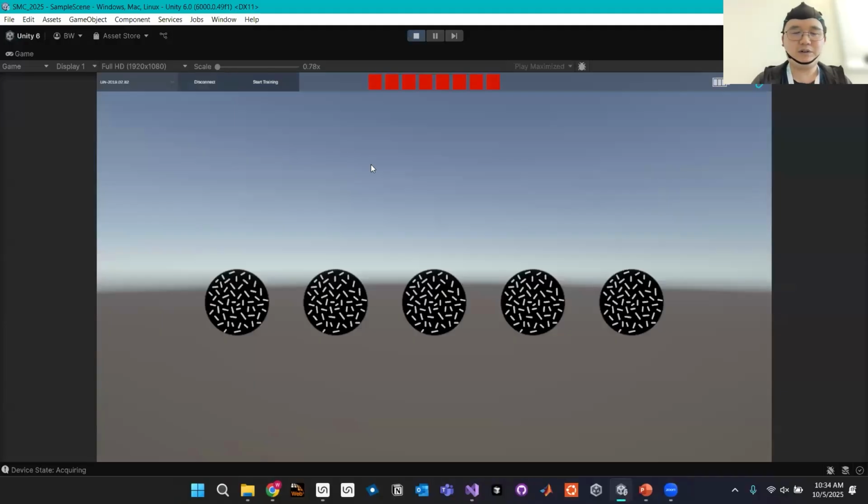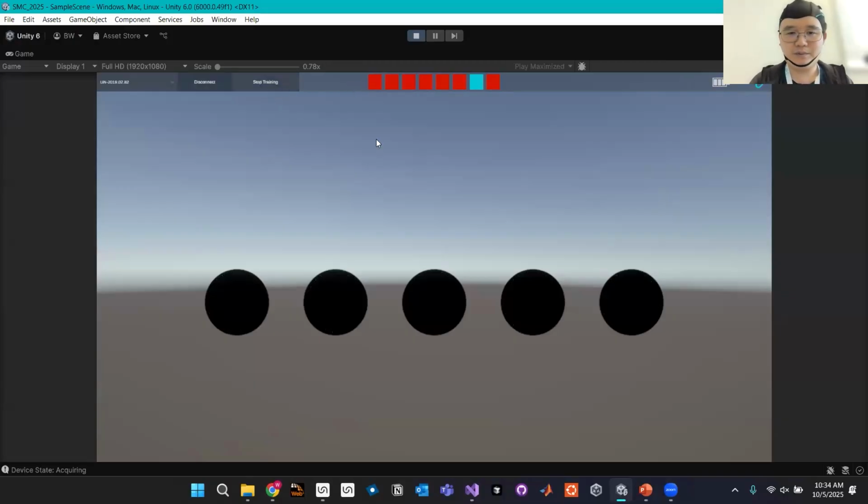Yeah. So now I have the data already. So if I run 20, yeah, seems like my data wasn't very good now because I'm talking for a long time. Yeah, but anyway, I can continue to see. 1 minute.